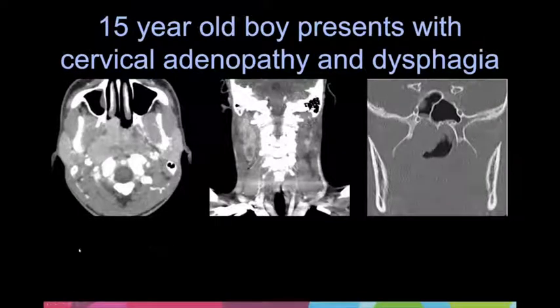Here's another patient with a right-sided nasopharyngeal carcinoma, moderately enhancing mass, invading the prevertebral musculature. There's extension towards the carotid sheath with the vessels deviated posterior lateral. There's ipsilateral internal carotid artery narrowing, large, bulky ipsilateral cervical lymph nodes, sclerosis of the right pterygoid base, and invasion of the floor of the right sphenoid sinus.